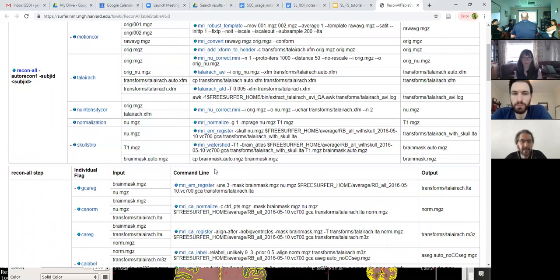So ultimately you may not ever have to run recon. You can, but you know, I guess we got new studies starting. So yeah, any new data coming in, you could run recon. So, especially in your case, Liz, I think you might be running this. But I think it's good for everyone to kind of know how this works.